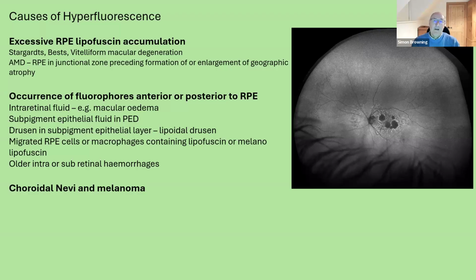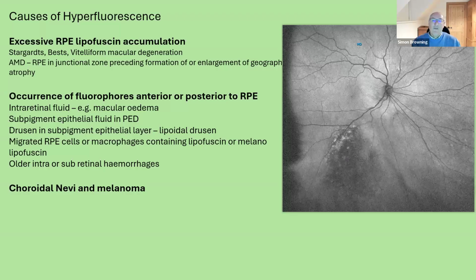Choroidal nevi or melanoma, and this is really important. One of the beauties with this is if you look at this, you've got the standard background glow on the retina here of lipofuscin, but here we suddenly see this is as if somebody sneezed on the retina. Sorry to use that analogy, but it's just like that. And you've got this sort of globular appearance of lipofuscin.